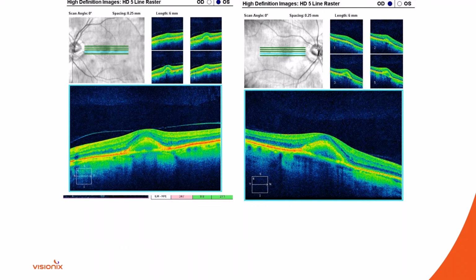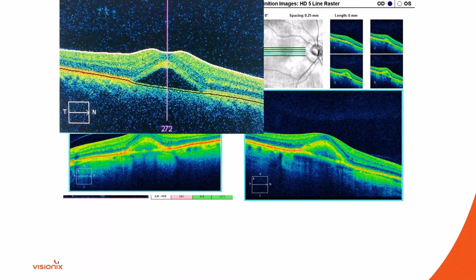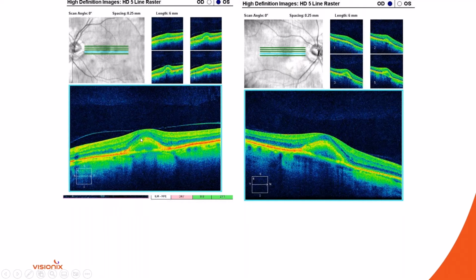And you know what this kind of looks like? I always show this and say, you know what the shape of this looks like? It looks like central serous chorioretinopathy. There's an OCT of central serous chorioretinopathy, but notice in central serous we have clear fluid right here, so that's why the OCT image is black, versus in this particular case, there's some substance there. This is not optically empty or black on the OCT.